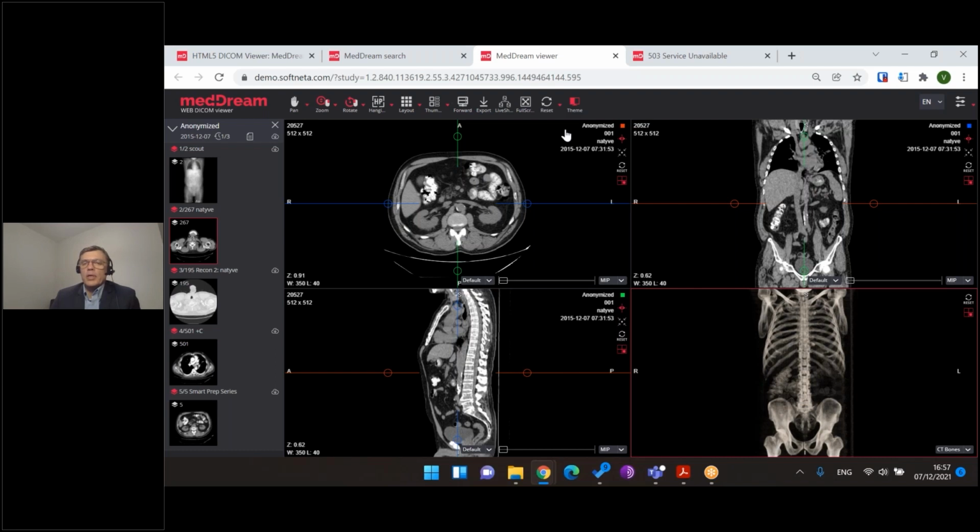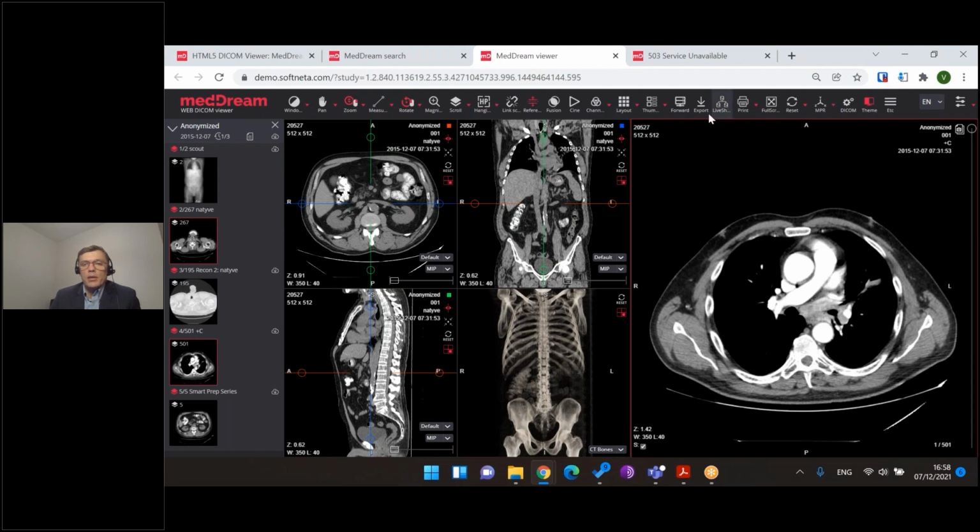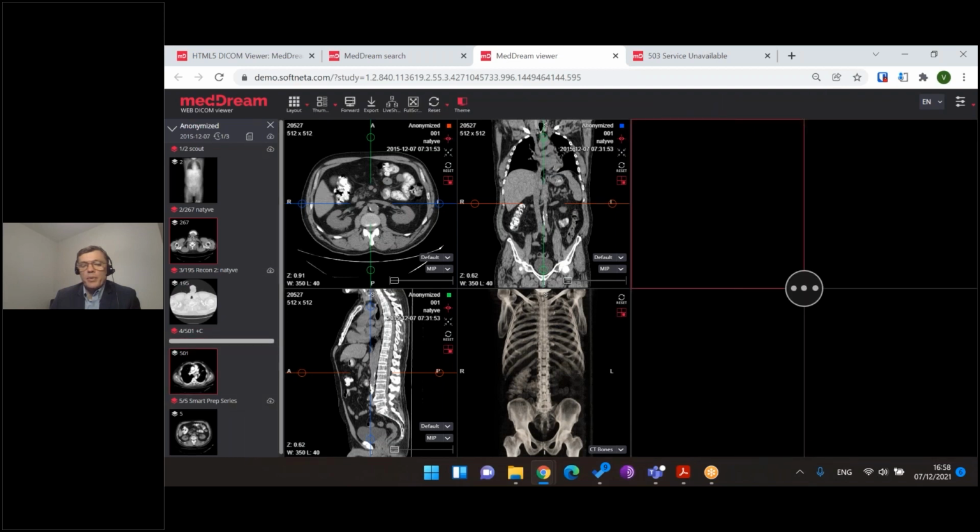So this is very long work. I would say it was 1.5 years to develop that. As you remember, in previous version we had only MPR functionality without 3D, and this version has significantly improved performance, and also we got a lot of improvement in the quality of images, and plus 3D was added. So this was a very huge thing which we did, and also the nice thing, you could also compare now. You could place two different MPRs in one view and have a nice experience comparing them.